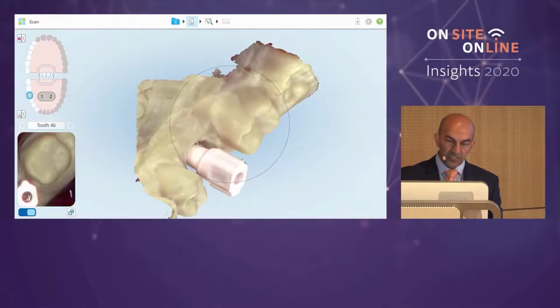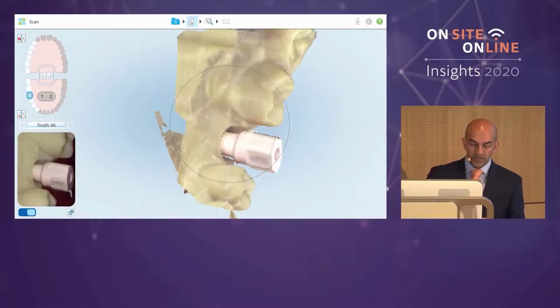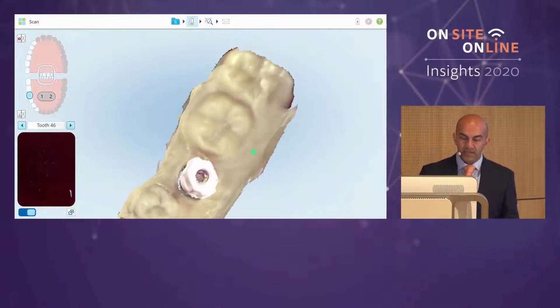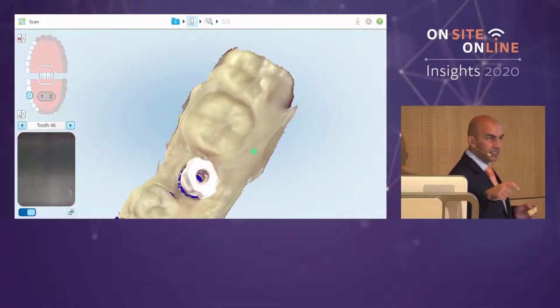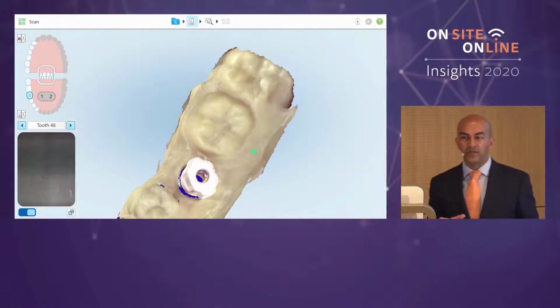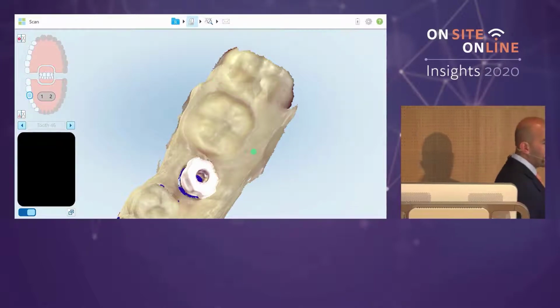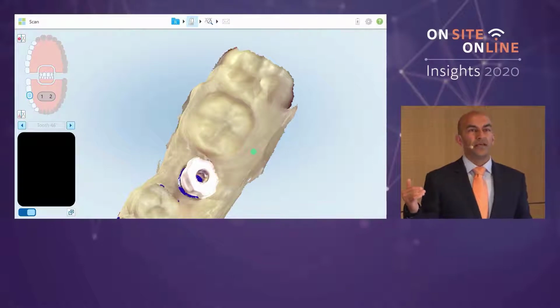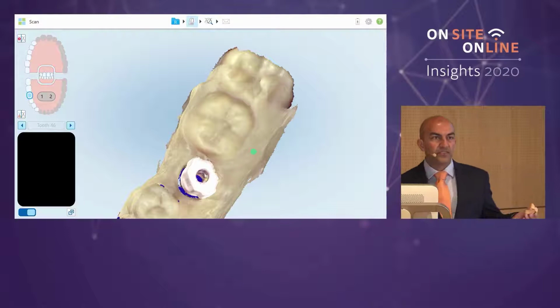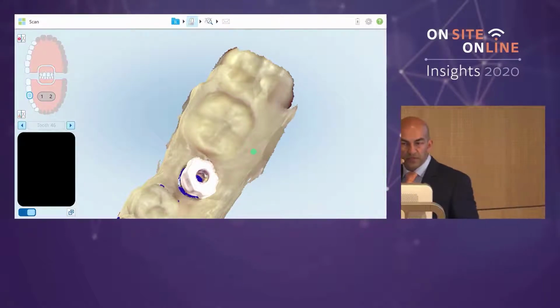And it's really important, especially if you're placing implants that are subcrestal, that you have a clear path of insertion into the implant. What I'm saying is that if that scan body hasn't been fully seated and you go through all of this process, that's how you get implant restorations that don't fit. I own a laboratory as well, and it's most common we see in our labs when people have not fully seated their scan bodies. The beautiful restoration looks good, and the technician says, well, it fits on the model. And then the dentist says, well, that may be fine, but it doesn't fit in the mouth. It's often because of little things like that.